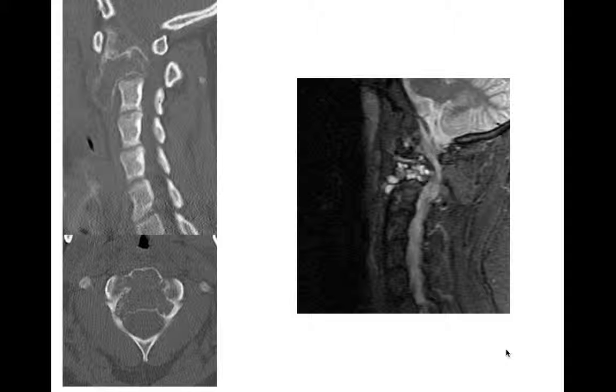It's not uncommon for aneurysmal bone cysts to occur within the spine or the vertebral body or the posterior elements of the vertebral body. This one's actually in the body itself. So a good place for an aneurysmal bone cyst, especially in a younger patient, as this patient was.